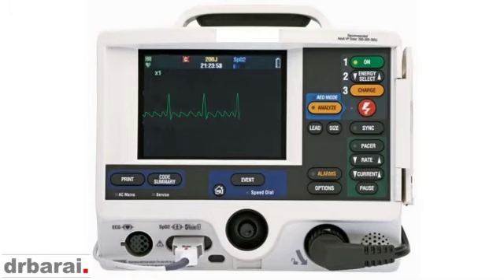Similar to atrial fibrillation, this is called atrial flutter. As you can see, the baseline has got multiple P waves, 1, 2, 3, followed by a QRS complex. And again, there are 3 P waves followed by a QRS complex, and then 3 P waves followed by a QRS complex. So this is atrial flutter. The QRS complexes are regular, and the P waves look like a sawtooth pattern.